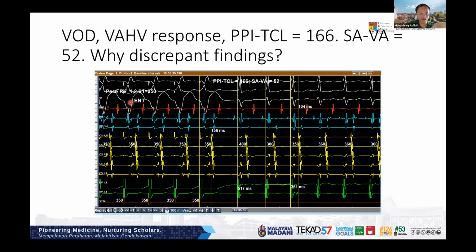So before that, I didn't show the EGM here, because I couldn't really show the dynamic fusion changes from the beginning of the treatment. Your leads in the top 12 leads, that's lead 1? Yes, there is lead 1, lead 2, and then your lead V1 is biphasic. Yeah, RV capture. Right? Yes. Pacing, RV pacing, lead 1 is biphasic.